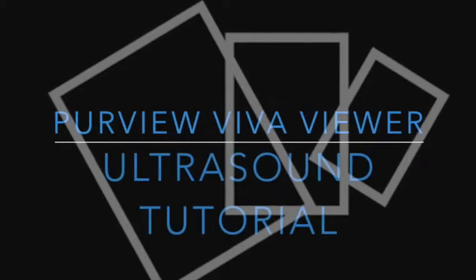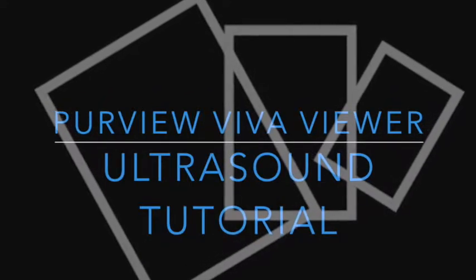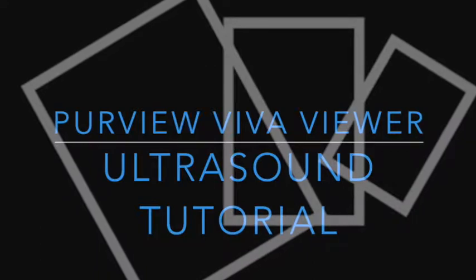Hi, this is Greg. Today I'm going to show you how to navigate your ultrasounds using the Purview Viva Viewer.